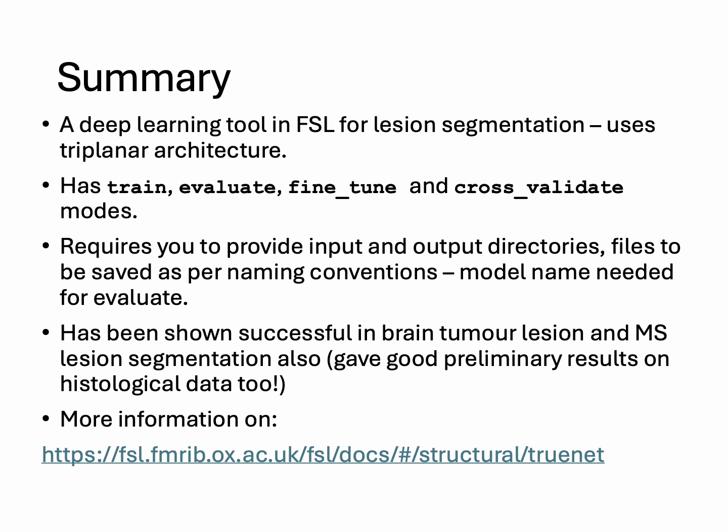All you have to mention is the number of folds. If you want leave one out, you can just give the number of folds equal to the number of subjects in the data. That will do leave one out validation. And then it requires you to provide input and output directories. And then the most important thing to note again is the naming conventions. Please be mindful of naming conventions, and the files need to be named in a specific format to be recognized by the TrUE-Net module.